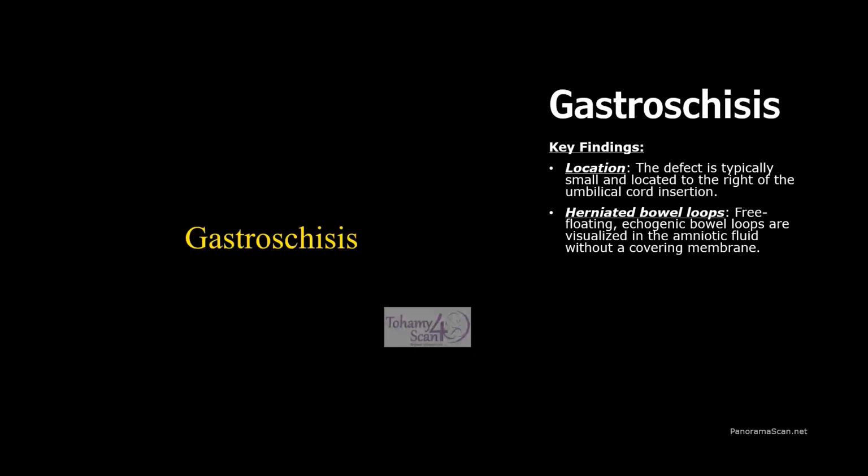You will observe free floating echogenic bowel loops in the amniotic fluid with no covering membrane. This is a distinct characteristic of gastroschisis. Amniotic fluid may appear abnormal, particularly if bowel inflammation is present due to exposure to amniotic fluid. This can also affect the fetal development.